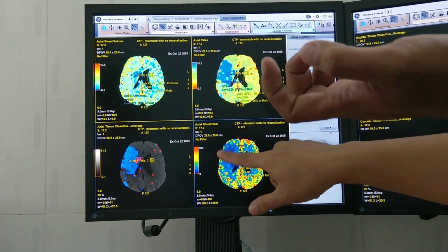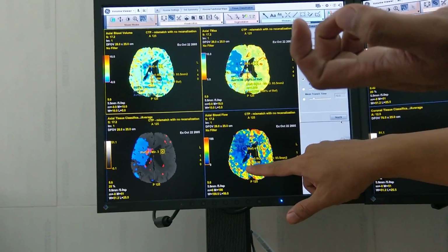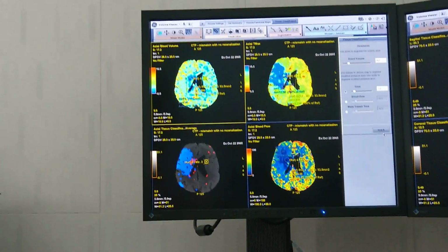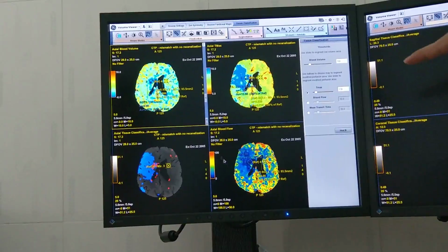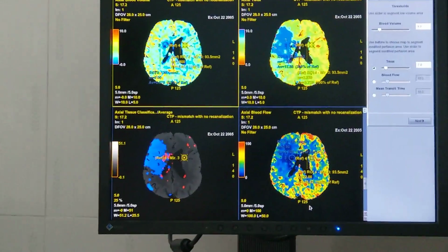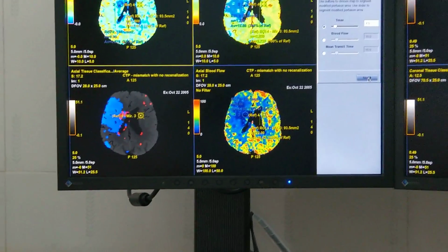If blood flow is bigger, the area. So I prefer T-max what GE says. Nghĩa là mình thấy rất dễ dàng, trừ phần này em thấy tổn thương, nhưng đối với phần CBF thì thấy tổn thương nó lớn hơn. Yeah. Thì đối với reference mình sẽ dùng T-max để đánh giá. Còn nếu dùng CBV thì tổn thương sẽ rất nhiều.